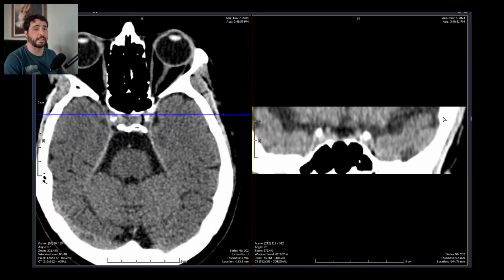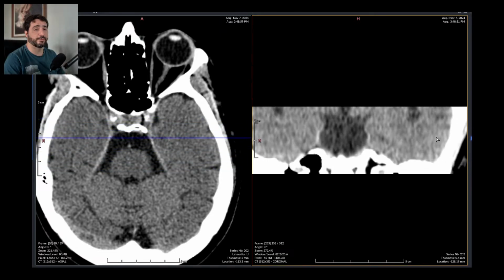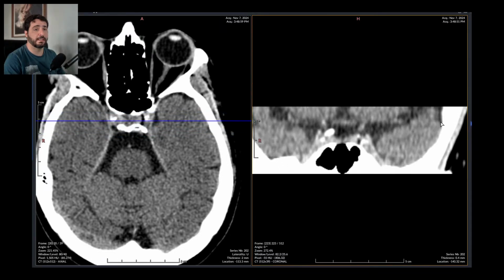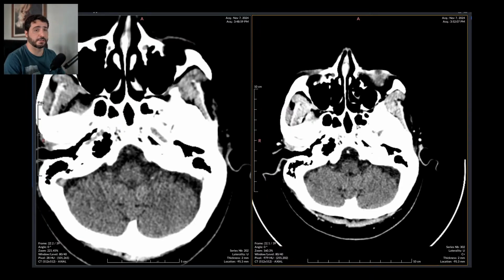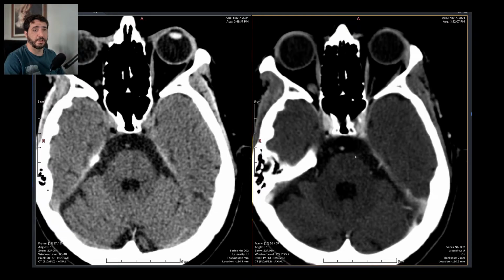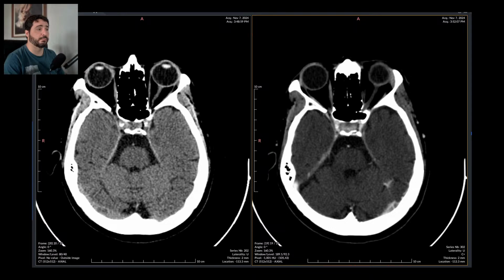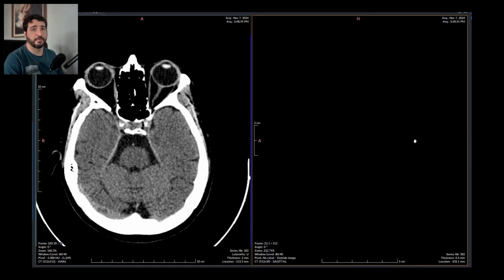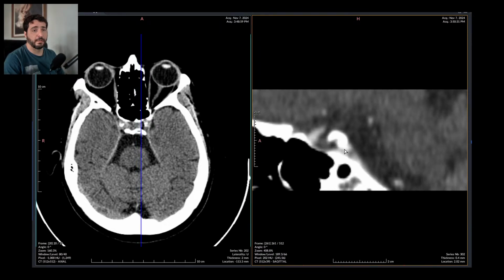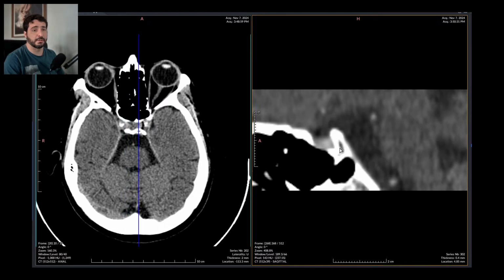You should stop it and say to the patient he should get a proper MRI scan to try to get any sort of diagnosis, because from a CT scan, unless he has a major, huge, humongous tumor, he will not be able to have any kind of proper diagnosis made out of this kind of useless exam.